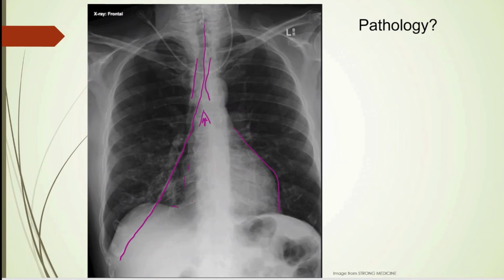D for diaphragms. Here's diaphragm on the patient's right, patient's left. Can't really see that because it was cut off. A lot of gas in the air in the stomach. Probably needs an NG there. What do you think?